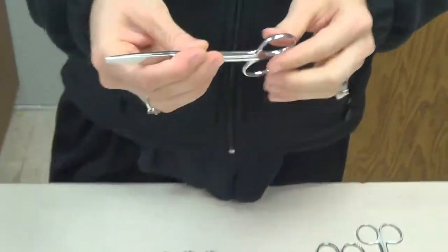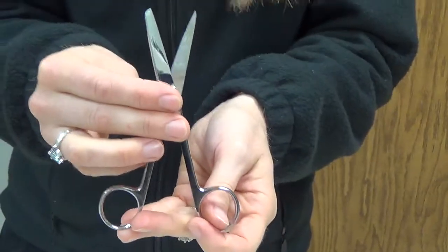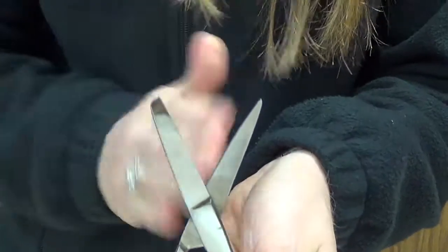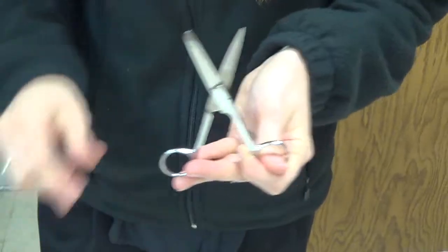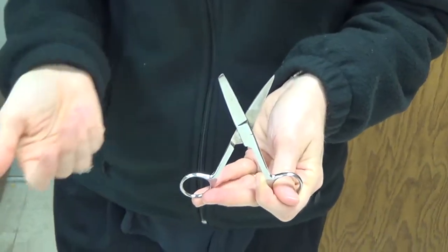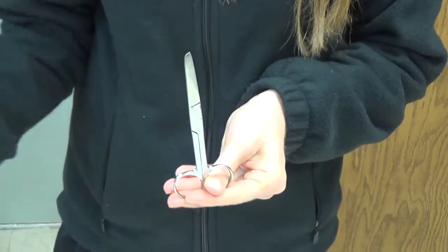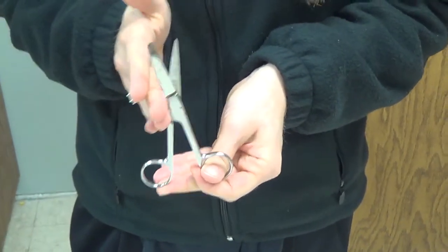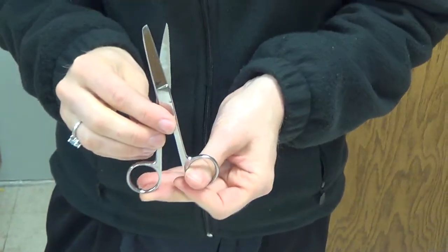And one final scissor that you might have on your field is what we refer to as a utility scissor, or some places will call it a sharp blunt, because you can see one side is sharp and the other side is blunt. Now this is just kind of a catch-all scissor. It's just an extra scissor that you'll find in your sets or on your table that can be utilized to cut dressings, drapes, all those kinds of things, so that we don't dull our suture scissor. Because if you use your suture scissor to cut your dressings and your drapes, you're going to have a really hard time cutting your suture. So this is kind of that extra scissor that we do any additional cutting that we need to do on our sterile field during the surgical procedure.